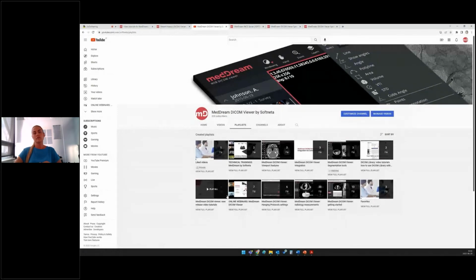You can find the video tutorial for every release. And for example, if you need just the integration theme, segmentation tools, as Vytautas mentioned before, radiology measurements, or for example settings, etc., new viewport features.